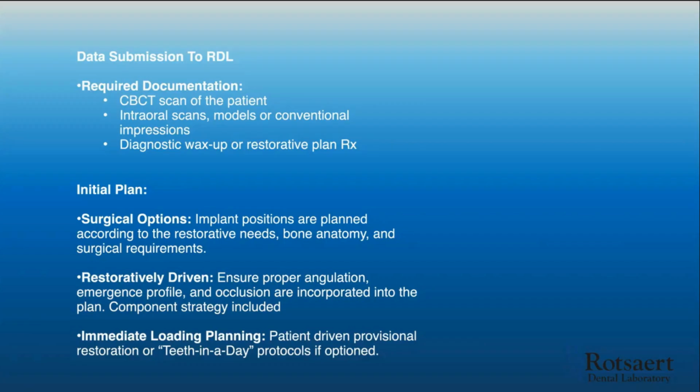And then implant immediate loading, I touched on it with that other case. Immediate loading or immediate function, which is the marketing term for it. But immediate loading is really often patient driven or indication driven. Their teeth are showing, or in the case of all on 4, all on X, I'll show that a little bit later. The patients need teeth. So what is that, right? Is it a denture? Is it screw retained teeth? How are they going to leave at the day of surgery?